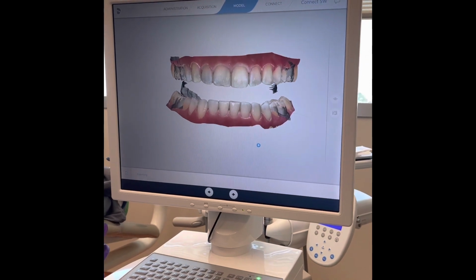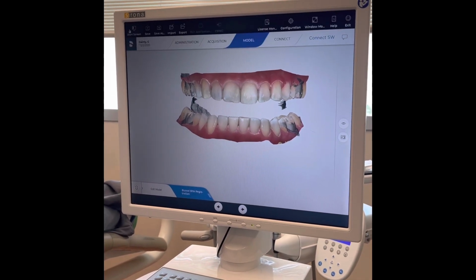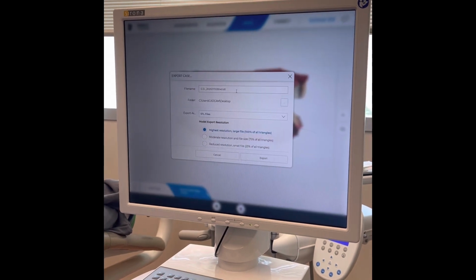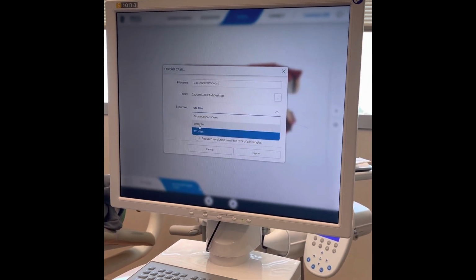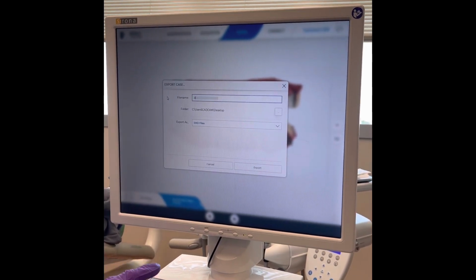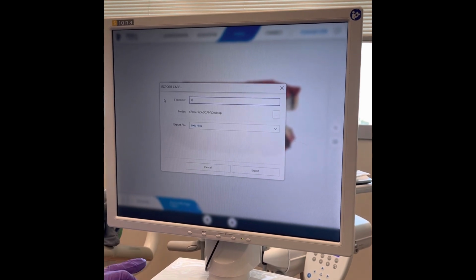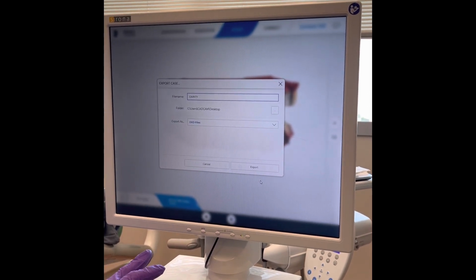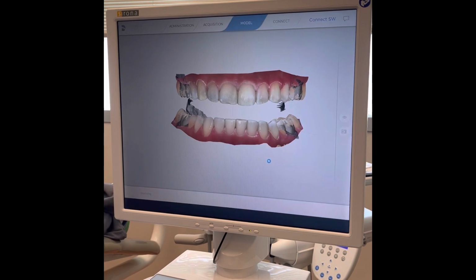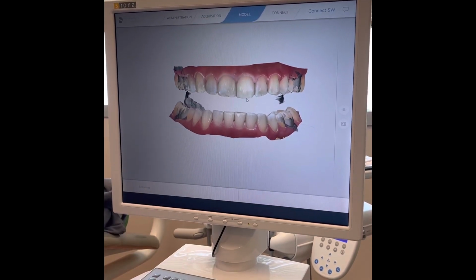If this is going to go to the Army Dental Lab, and they're going to see it before ProSomnus, what we can also export is a DXD model. And what the DXD model will allow us to do is if the ADL wants to make any modifications for any reason, this DXD will allow them to take this to the Dentsply Sirona in-lab software if they want to close off our models or base our models.